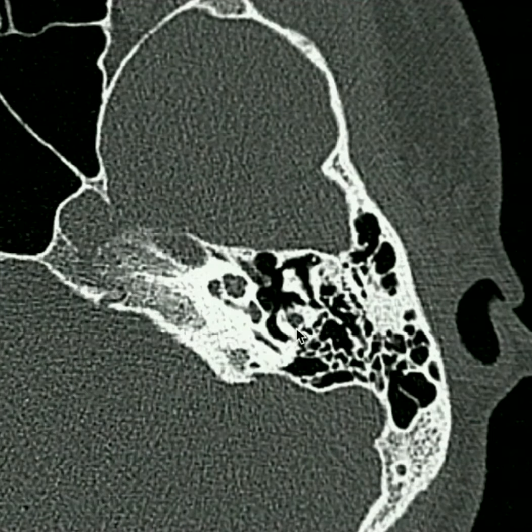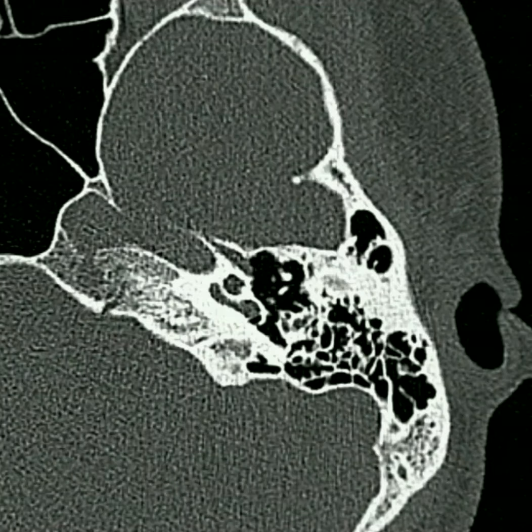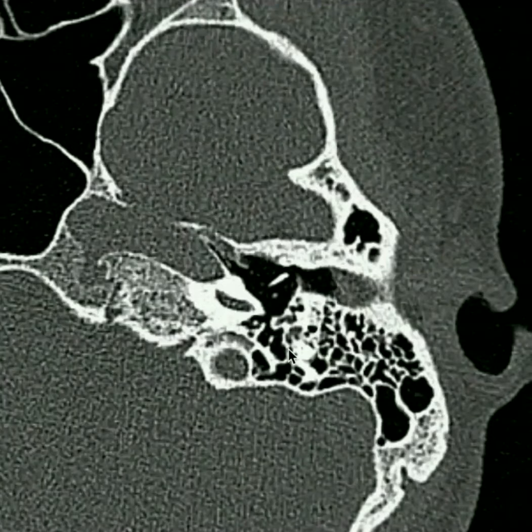Scrolling down, we're going to see this little branch of a nerve representing Arnold's nerve coming off a canal right here. This is the mastoid canaliculus. So let's continue to follow it down, and we'll notice that it's going to get down to the skull base down here.